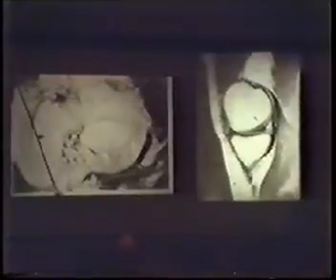Now, I'd like to talk a little bit about the menisci and meniscal anatomy. This is a knee photographed from above that has been disarticulated, and this is the medial meniscus, and notice how it has a very large radius of curvature, and this is the lateral meniscus with a much smaller radius of curvature. The image on the right is right along the plane depicted by the spinal needle, and so what you can see is the posterior horn of the medial meniscus, and notice how much bigger it is than the anterior horn. And then you can see the medial femoral condyle, medial tibial plateau with a very characteristic champagne glass configuration, and the muscles and tendons.